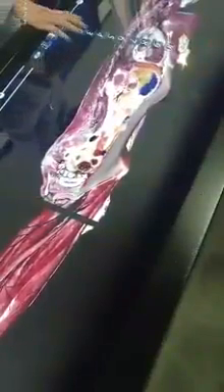Section. So here I can start off with down the middle. And then from here, I can show the anatomy as it was at the time of death. So everything is accurate, there's no rendering done. Since the cadaver was flash frozen, there were scans that were taken of the cadaver itself. And then from there, you can see the anatomy as it was at the time of death. You can also isolate or annotate different parts of the system.